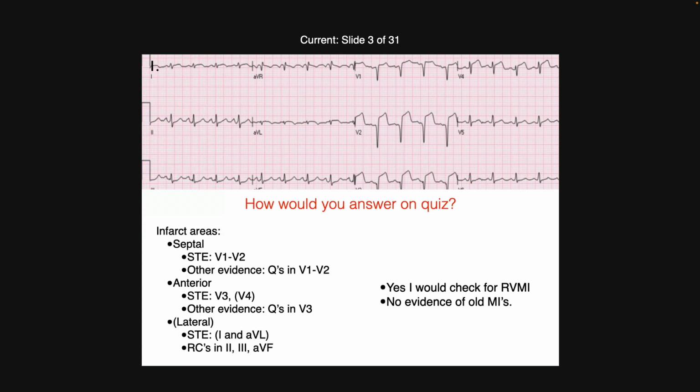I don't quite know how to answer that. I don't think so. I was thinking if you're going to have low amplitude diffusely, I would think of maybe someone being obese or pericardial effusion, but relative to the leads next to each one of those, they're honestly pretty small. I don't think so. Okay.